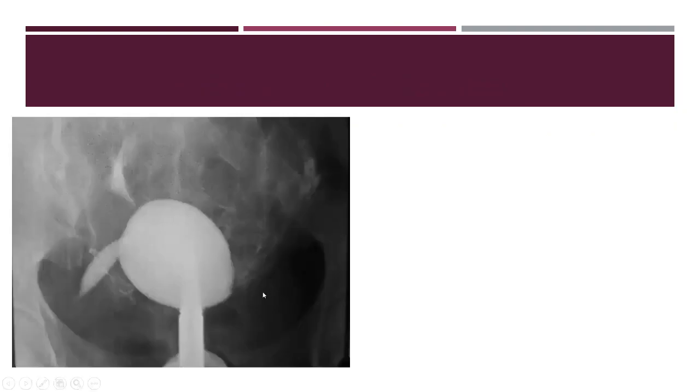What about this case? I have two endometrial horns, but what is this? It was a very odd appearance, but you have to do an ultrasound. If you have a very odd appearance, you have to have a look by ultrasound.